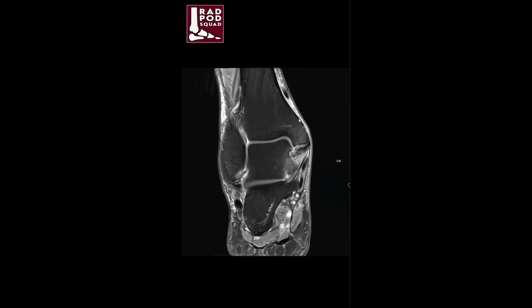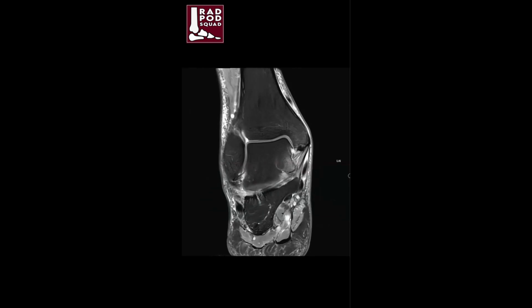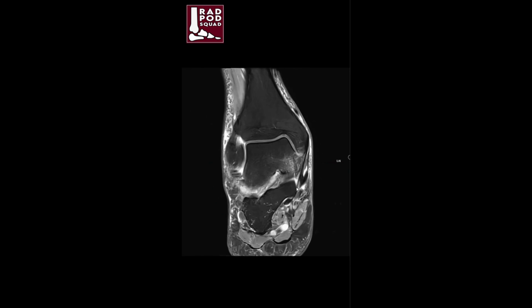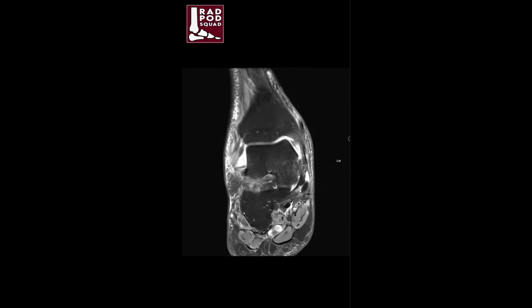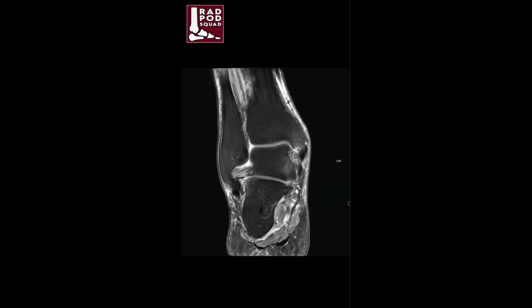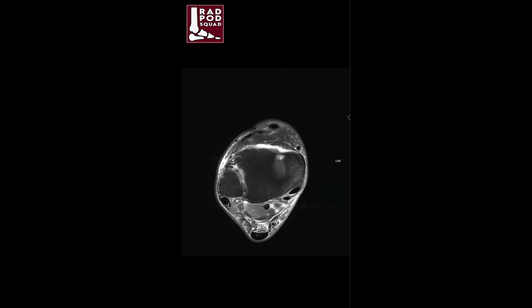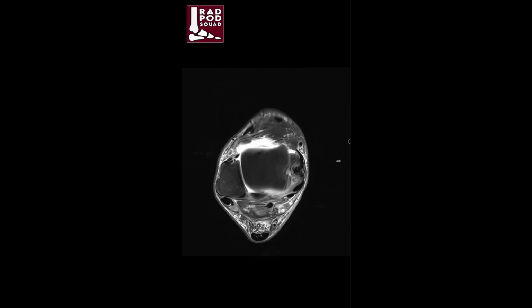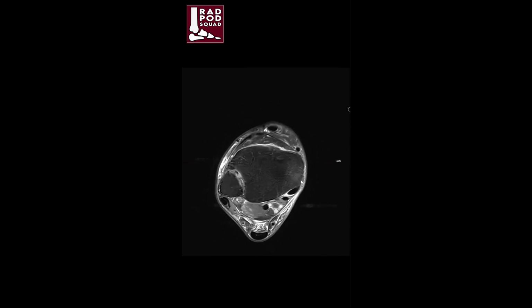And then let's just take apart the rest of the medial ligamentous complex with the flexor retinaculum, the tibial spring, and more sprain along where it attaches to the superomedial band of the spring ligament here. Looking at the medial flexor tendons, best seen axially, hypertrophic PT tendinosis, medial flexor tenosynovitis to the master knot of Henry, medial flexor retinaculum intact with spraining and no evidence of tendon subluxation.